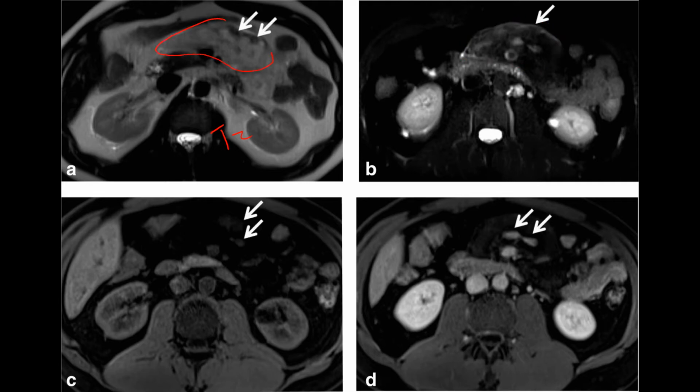Here we cannot see that clearly because there is fat in the rest of the abdomen, so we cannot differentiate. But when we do a fat suppressed T2 image, we can see a bright area here which is very well defined, with a well defined margin in the mesentery, appearing bright on T2 fat suppressed image, suggesting there is an edema there. So there is an edema, but is it a mass lesion?